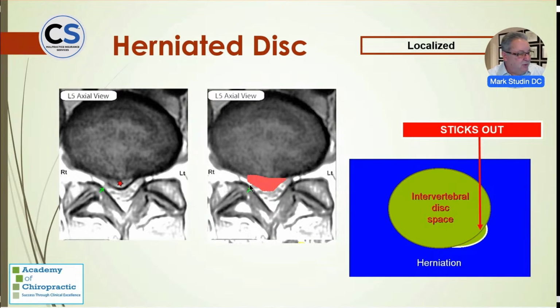It's very simple. You get to see all these things and see why. This is on the right side. MRI is read right and left. It's reverse. And on every image, you'll see right and left. But you get to see why your patient's in pain. And you'll be able to understand it and help them better. And you get to make a clinical decision of how you want to treat this patient.